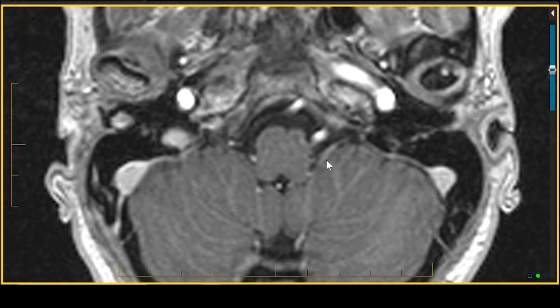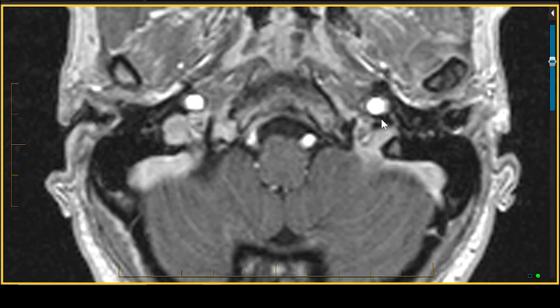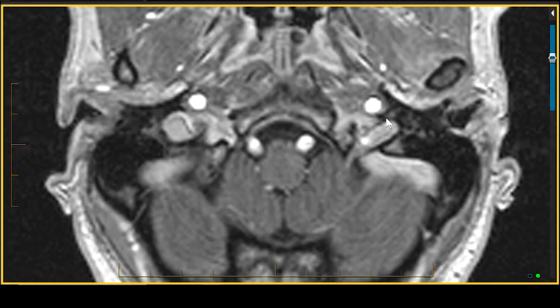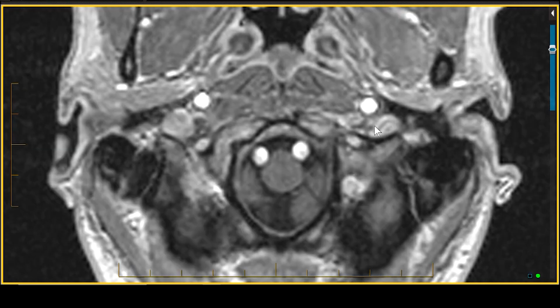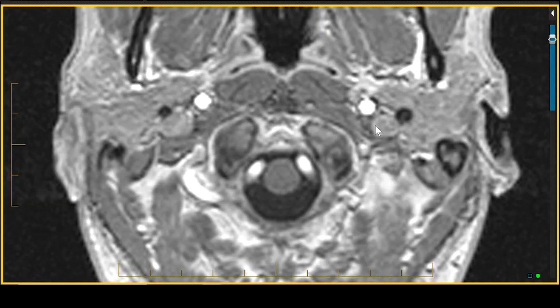Dr. P here. I want to talk to you about the descent of the vagus nerve. Now, here's the vagus and glossopharyngeal nerve. As we work our way down, you can see the nerves crossing anterolateral, and you're going to follow them into a space right between the internal carotid artery and the jugular vein. Now, I'm going to go down as far as I can, and this is where you're going to find the vagus nerve on your way down, traveling between these two structures. So sometimes you're going to have to infer its location, and this is especially important when you're looking at glomus vagale tumors or schwannomas of the vagus nerve. Now, I'm going to go as low as I can.